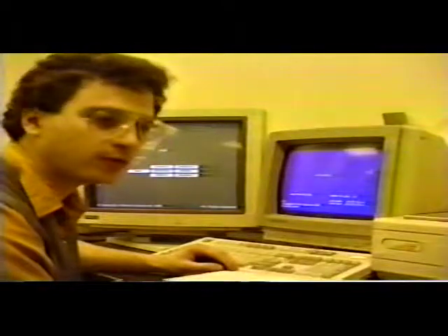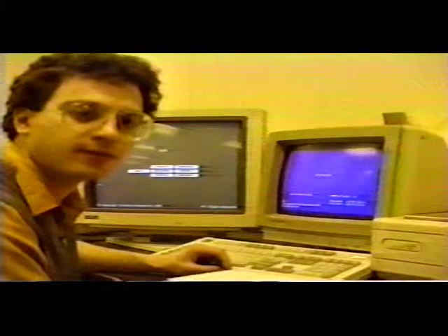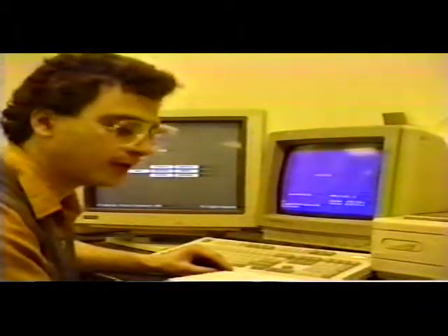The computer is a 386 made by Compaq. It could just as easily be a 286. The speed of the program is achieved through careful coding and through special function hardware on the Number 9 board.